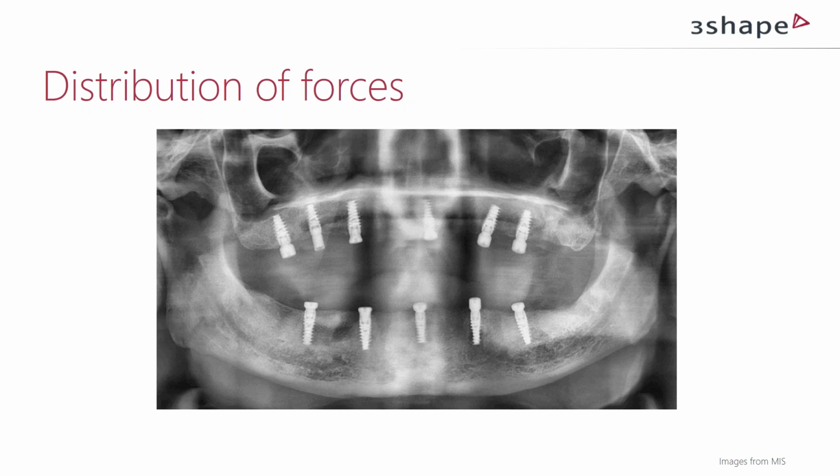A good basic rule, because you think, how many implants should I place? Let's say that every implant can carry approximately 1.5 teeth above later on. So 5 implants means 7.5 teeth, or maybe up to 10 teeth even.